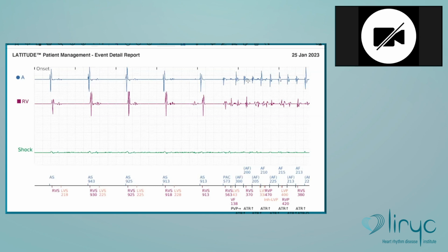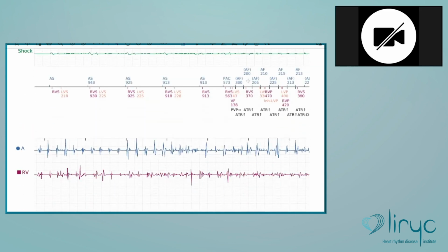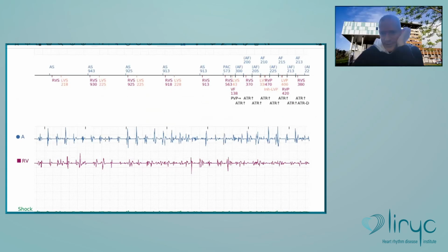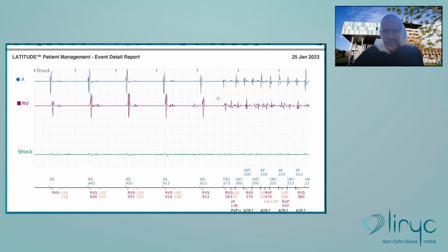Not sure, honestly. At first it could be atrial fibrillation. You agree? Okay. If you look at this, that seems real. These are real signals. Now let's consider it's a single lead, a single-chamber ICD with just a ventricular lead. What would you say here on this one?